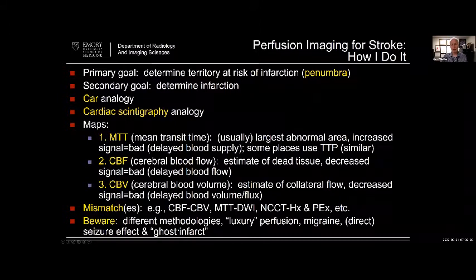And then there's a thing which is fairly recent in terms of what people talk about, which is ghost infarct, where you do the perfusion and it looks like the patient has had a large artery territorial infarction. But then, classically, it's a younger patient, intervened on kind of early, depending on the circumstances, and maybe it wasn't an infarction, but territory at risk for infarction. So again, everything you learn has an asterisk, but it's hard, and a lot of the things you kind of focus on. So start with the core stuff, no pun intended, and then move out from there.